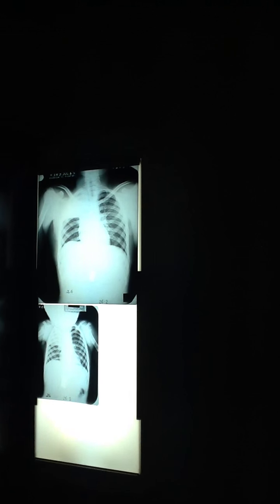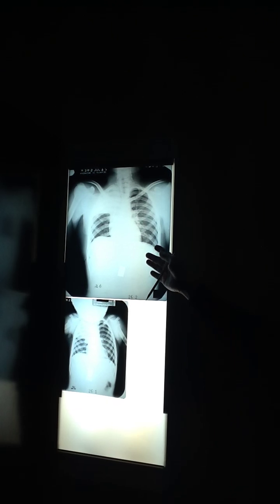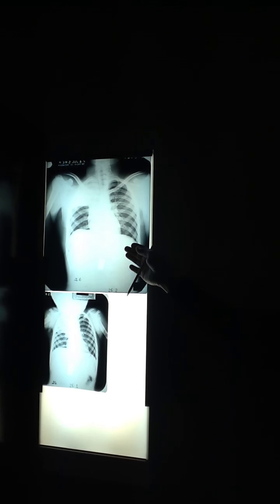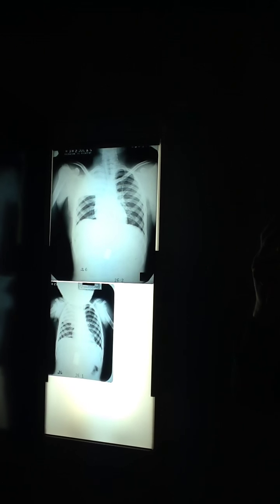So the lung moved to water density. In the initial assessment, is that a unilateral, localized water density? Yes. Listen to what the word said: unilateral, localized, water density. It is localized to the upper right lung field. And we've been talking about this. The initial assessment is very generalized. We didn't say it's in segment 1 and 2. We just said it's in the upper right lung field.